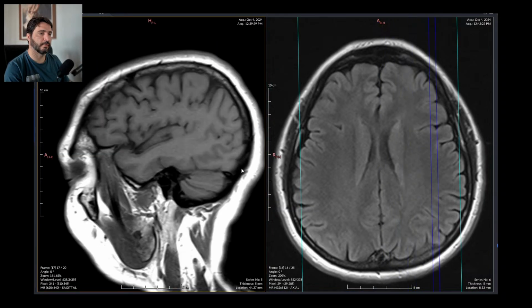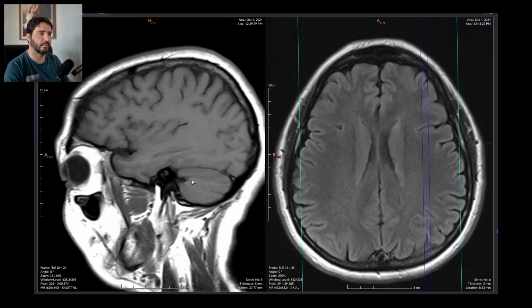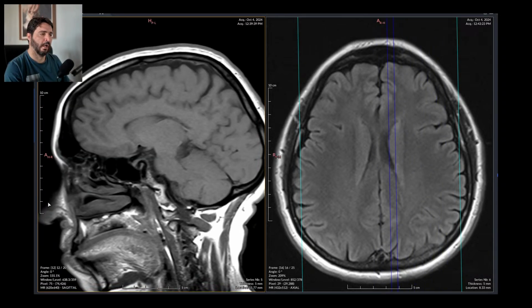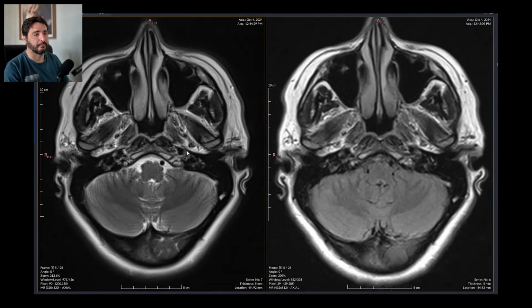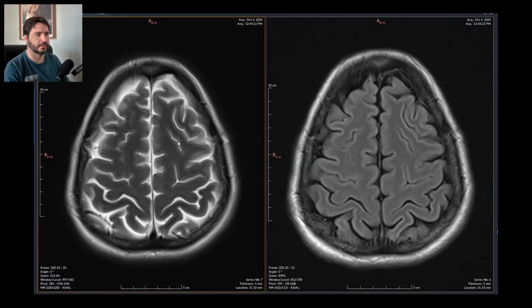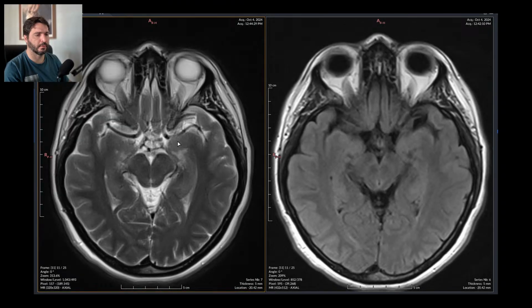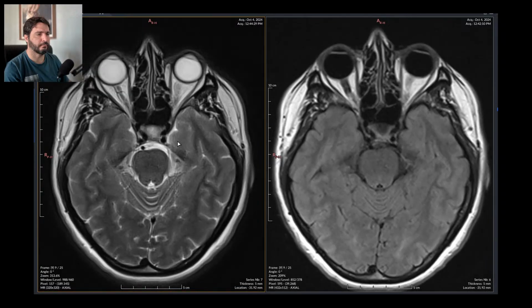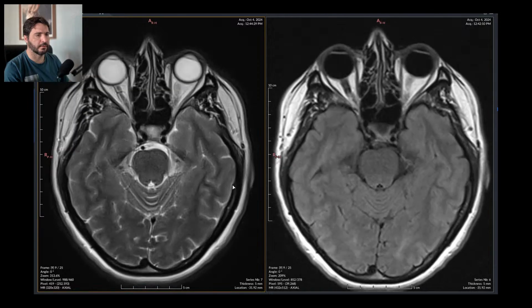The brain has a proper volume. The cerebellum is fine, the fourth ventricle as well. I can't really say. Oh, I'm sorry. Excuse me. So this is a T2 weighted axial image. This is quite like this, just without the inversion recovery pulse. For normal liquid, this is best for anatomy, and some pathologies. So mastoids are fine.